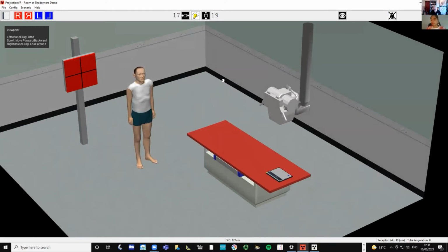You described how you're in lockdown and how you want to get the students some clinical experience. One of our universities has been doing vivas with the students. They've been talking the tutor through what they're thinking while they x-ray the patients in the virtual environment.